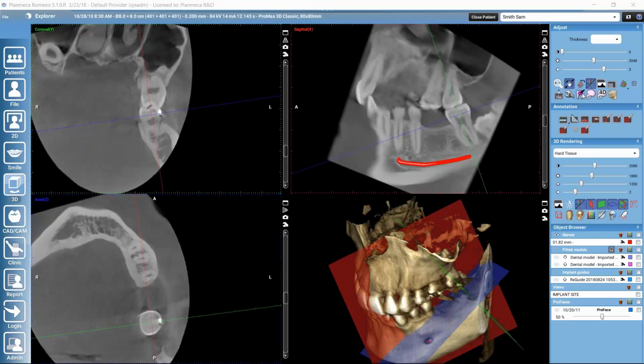And if you would prefer to use both of these buttons and both of the modes for each button when you're navigating into data, we actually also have keyboard shortcuts for these functions and for some other functions here in the toolbar as well. So you can see the Romexis user's manual in order to see the full list of different keyboard shortcuts.